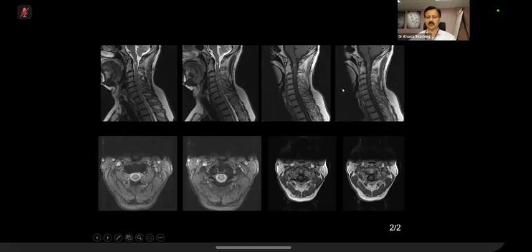So hemangioblastoma, of course, you can keep in the differential, as we have discussed before, that classically there will be a tumor blush. I've shown you hemangioblastomas previously when we covered phakomatoses. And that will be very, very densely or intensely enhancing.